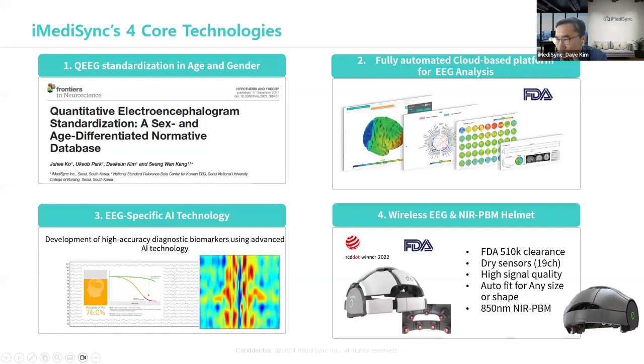Our EEG analysis specialty is the AI denoising. We can make clean data without labor-intensive manual processing. But sometimes the AI is not perfect. In that case, we can do manual denoising when the AI denoising is not perfect. But basically, we keep the automatic analysis, so many clinicians can take advantage of this kind of automatic QEEG analysis.